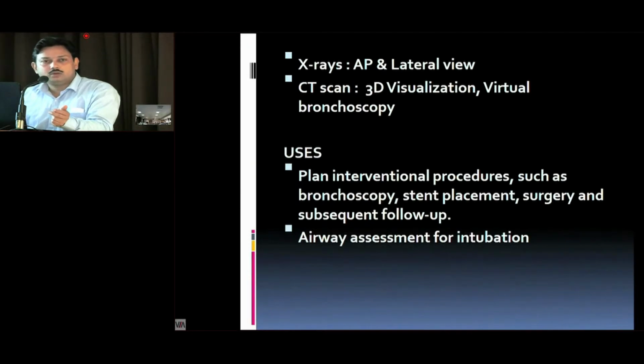The patients who undergo difficult thyroid surgery or with large masses, usually CT is done to see the vessels, to see the extent of the mass. So from the same CT data, we can evaluate the airways. We don't need to perform another CT to see the airways. From the same CT data, we can nicely evaluate the effect of mass on the trachea, bronchi, everything we can see, and I'll be showing you what are the techniques which are available with us.